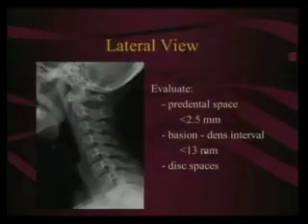So if you assess how overlapping those mandibles are, that will help you put in perspective the rest of the things that you look at when you're evaluating your study. And then, of course, every once in a while, you can pick up a skull fracture on these. So don't forget to look at the corners of your films.